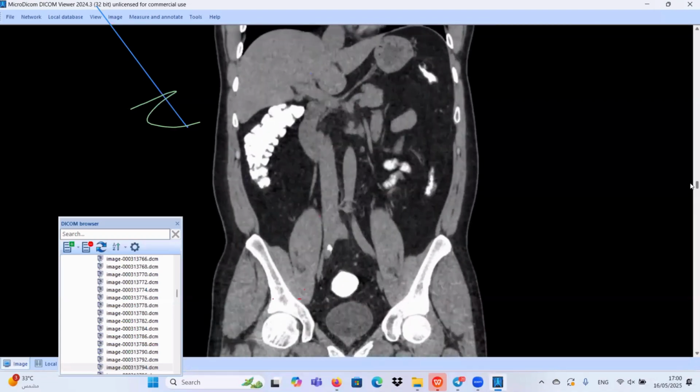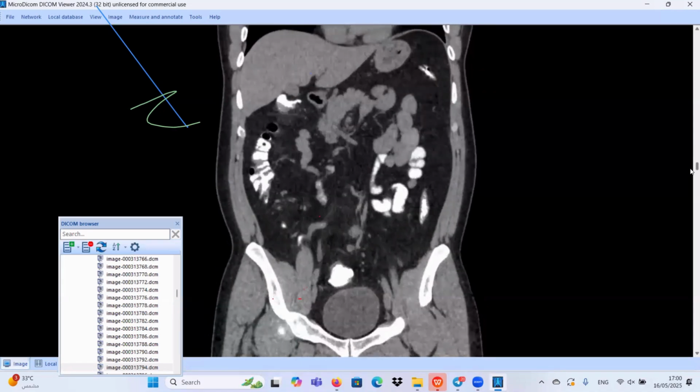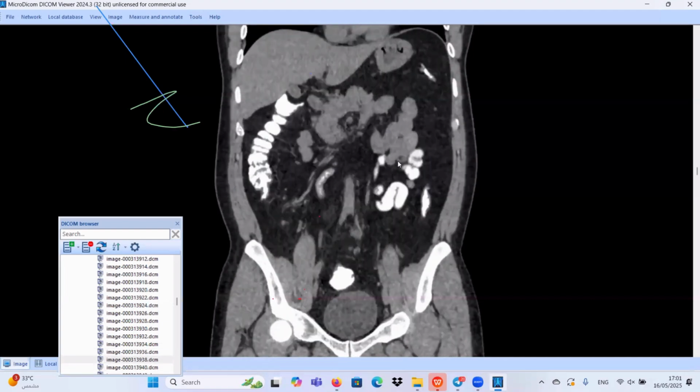Okay. So I want to check if it has any contrast enhancement. I'm sorry, I prepared the IV contrast study, but I didn't find it here. But it's obvious now. This is the aorta. Yes, this is the wall of the aorta. Maybe this is a tumor coming from the wall of the aorta, like leiomyosarcoma or angiosarcoma.